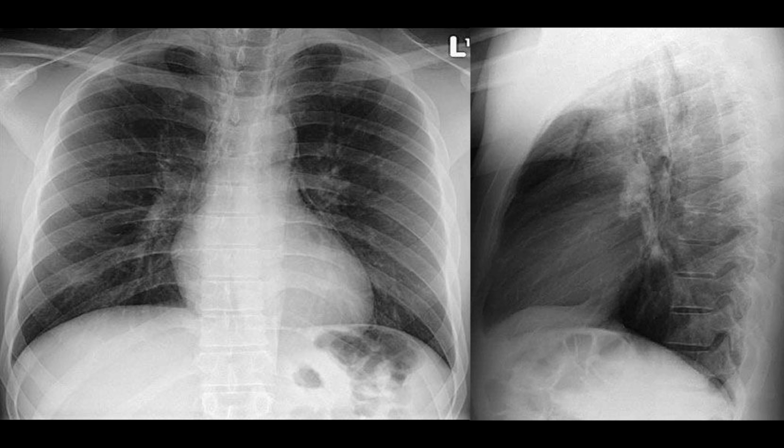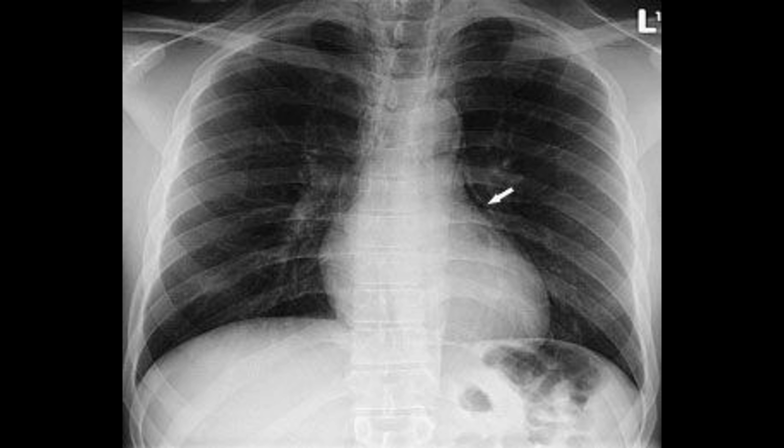This is a chest radiograph of a young man presenting with sudden, severe chest pain. The frontal radiograph shows a rim of lucency adjacent to the left heart border and increased lucency outlining the aortic arch and right paratracheal region.